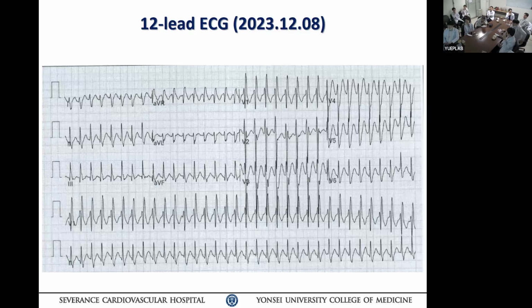Also, if you look carefully, the T wave morphology is not exactly the same. The T wave keeps changing, so probably there's another wavefront in there. Look at the lead 2 bottom tracing, the continuous tracing. Keep looking at the T wave morphology. It's slightly different. Sometimes it looks a little wider, some look narrow, some look notched, right?